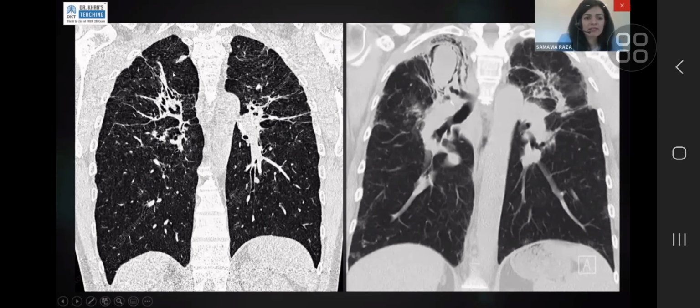For example, here you can see this part of the lung almost looks like it's turning into a bulla because the fibrosed part of the lung is pulling it. What happens in that scenario is that it will ultimately turn into a cavity. You can have a cavity inside a dead part of the lung or a fibrosed part of the lung, and that cavity is essentially a breeding ground for opportunistic infection. So that's what happened in this CT, and that space has actually grown an aspergilloma.